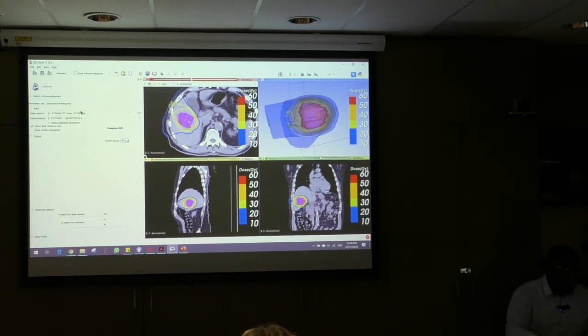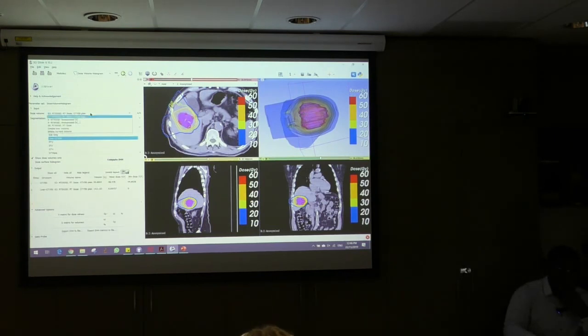And the workflow is quite straightforward. You have the dose you want to compute the dose volume histogram for, and then you have the structures. In its current form, it will compute the dose volume histogram for all the structures. This can take quite a while, so to save time, we will just select two structures, the tumor volume and the uninvolved liver. And we can compute the dose volume histogram. It doesn't take long. And we can do this for the CyberKnife plan as well.